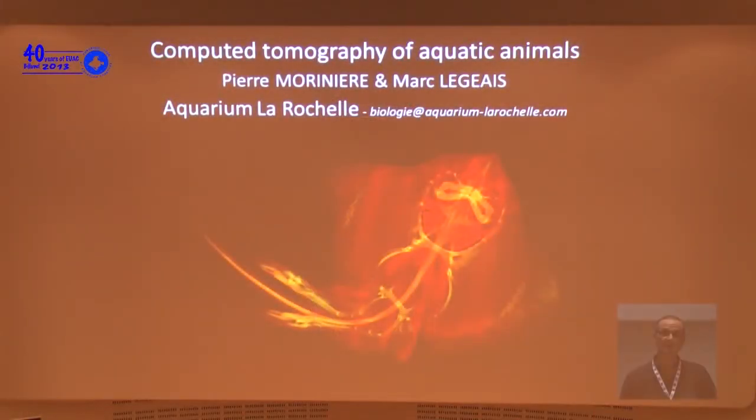For the last presentation, we only have to look at some images, very easy. With Dr. Marc Leger, a radiologist, we work on his initiative with a medical scanner to examine aquatic animals. He was curious to explore other animals, and human bodies all day.